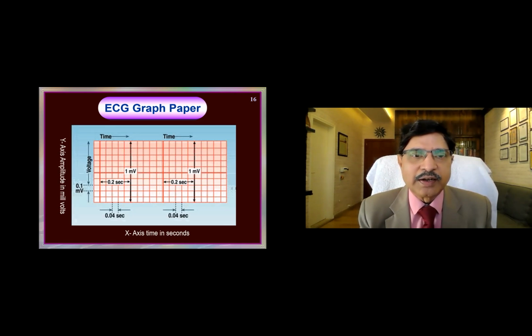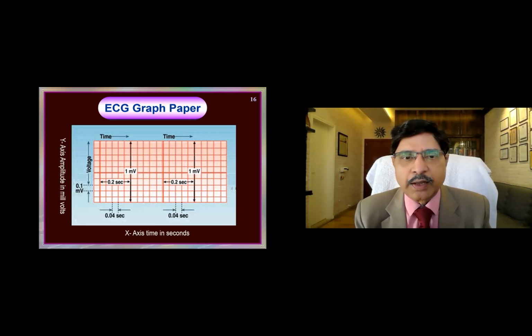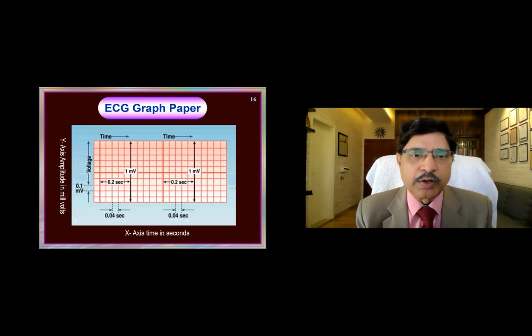So that little current has to be recorded here. In fact, it produces even microvolts only in the heart, that is amplified in the ECG as shown as millivolts. We don't even have millivolts current. It is even microvolts current that has been amplified on the paper to show that it is in millivolts.